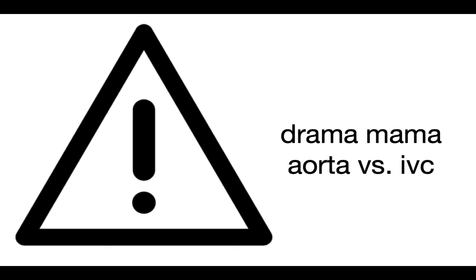The IVC has a bit of controversy surrounding it, a bit of drama, if you will. It originally arose, and we thought it would be a good marker for how to guide our fluid resuscitation in many categories of patients, but instead now what we're finding is the IVC itself and the IVC collapsibility may or may not actually dictate if a patient is responsive to fluids.